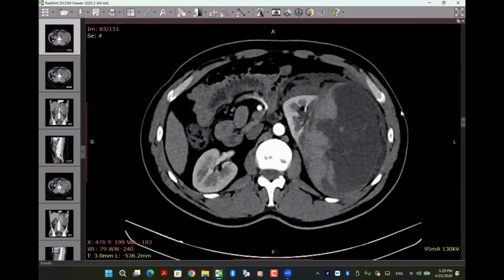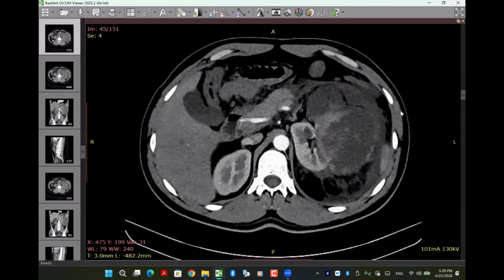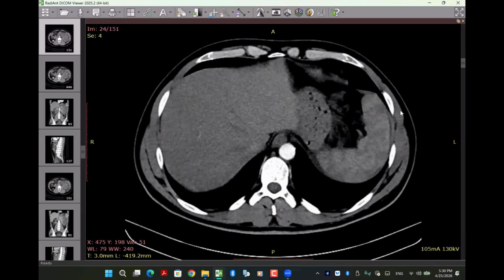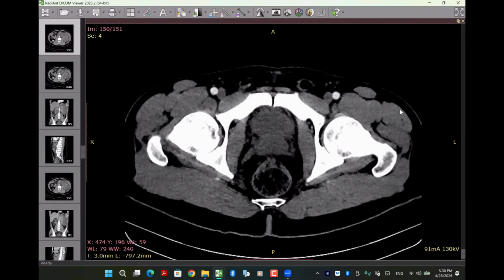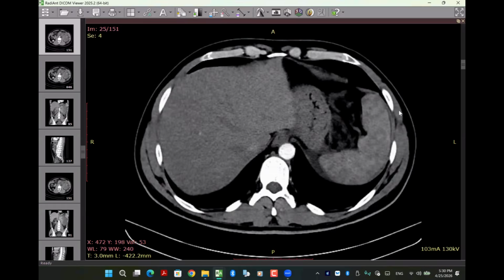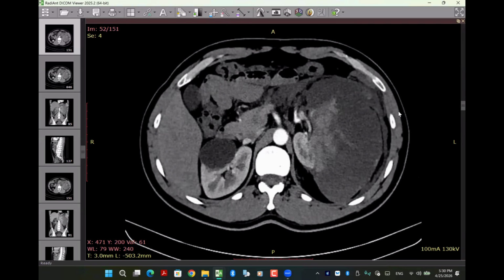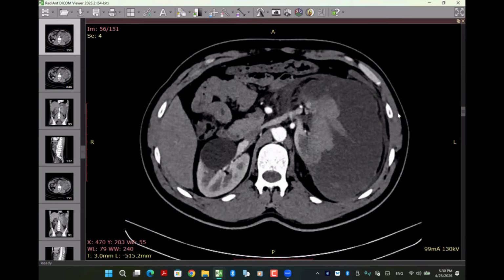I think the differential I told earlier. So this could be retroperitoneal hematoma, urinoma with old collection, or retroperitoneal sarcoma. The other possibility could be neurogenic tumor. But this is actually fluid density with high content. Stick to the hematoma, okay? First, you gave a marvelous differential diagnosis, but stick to the hematoma. You told me there is no extravasation, and this is a very strong comment.